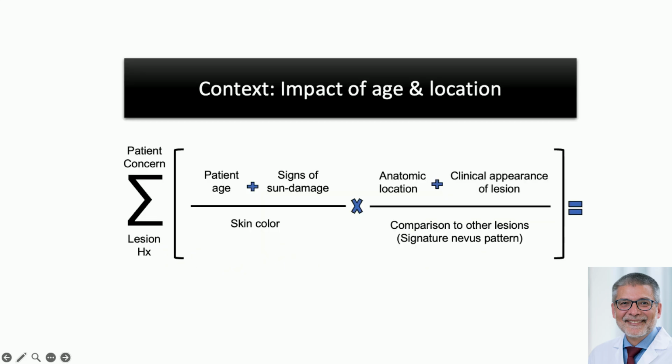So what is the caveat that's important here? There are actually two. One is patient age, and the other is location. And remember the globular pattern mainly on the torso, head, and neck, right? And it holds true for this group of lesions as well. In terms of age, new nevi tend to develop in youth, up to about age 40. You can develop new nevi after age 40, but it becomes pretty uncommon. So new peripheral globular lesions in somebody in their 50s, 60s, 70s becomes concerning just by the fact that you shouldn't be having a new growing lesion at that age, right?